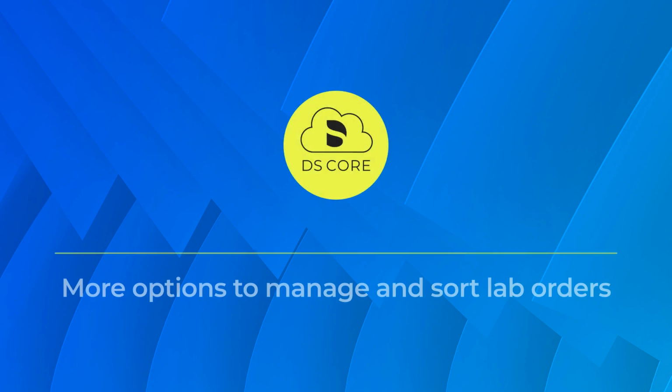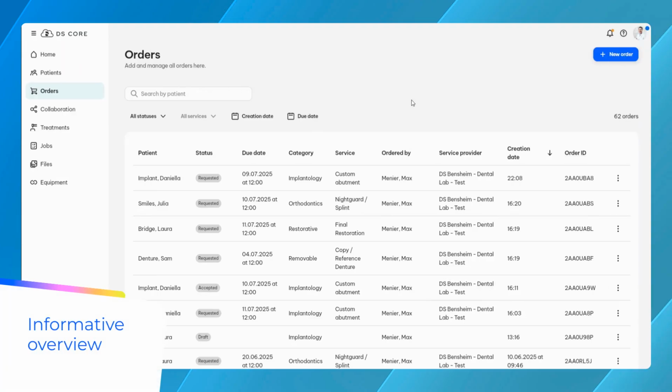The following process describes the latest updates to manage lab orders in DS Core. Let's begin. The order overview now includes the following additional information: category like implantology, the team member that has placed the order, and the service provider fulfilling the order, like the preferred lab or Atlantis.